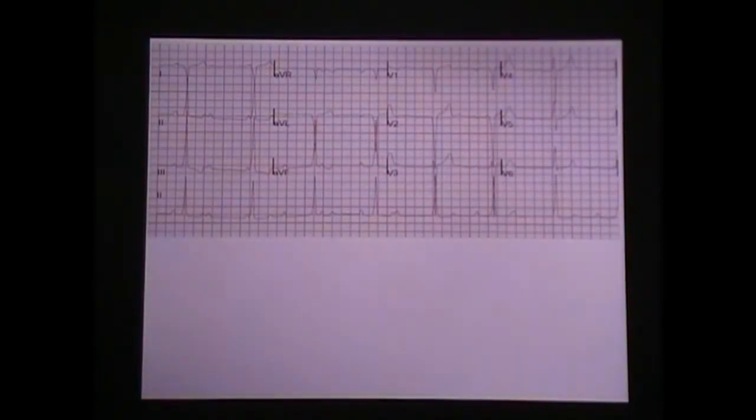Okay. So, and then T waves. Well, because it's a bundle branch block, sometimes these come to the concordance, discordance type thing, where there's some criteria that would be met. Normally, if it's discordant, it's not an MI.